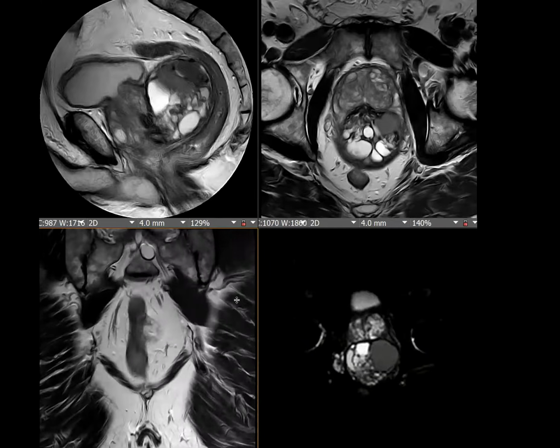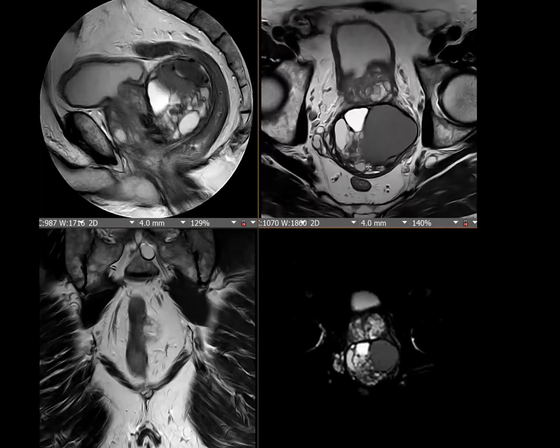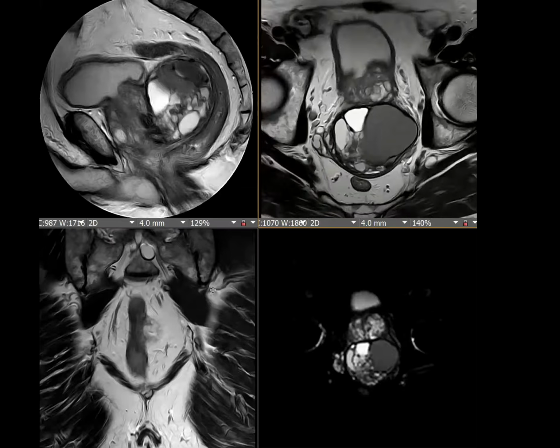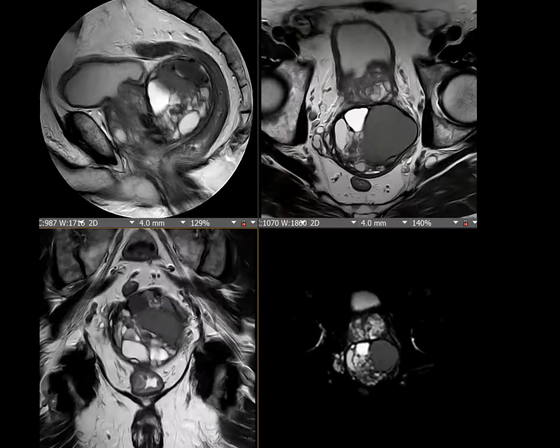Ben, my friend just showed me a case like this, and hers though was more in the prostate, and it was a giant cystadenoma of the prostate. Actually, we went back and forth with this, but we also think that this is coming out from the prostate, and that's what we ended up saying. We said cystadenoma versus cystadenocarcinoma, and this is a recent case. I don't have any biopsy or additional information after our read was placed, but this was an interesting case. I hadn't really seen this before, and that's just an entity for me to be aware of, and I wanted to share with the group.